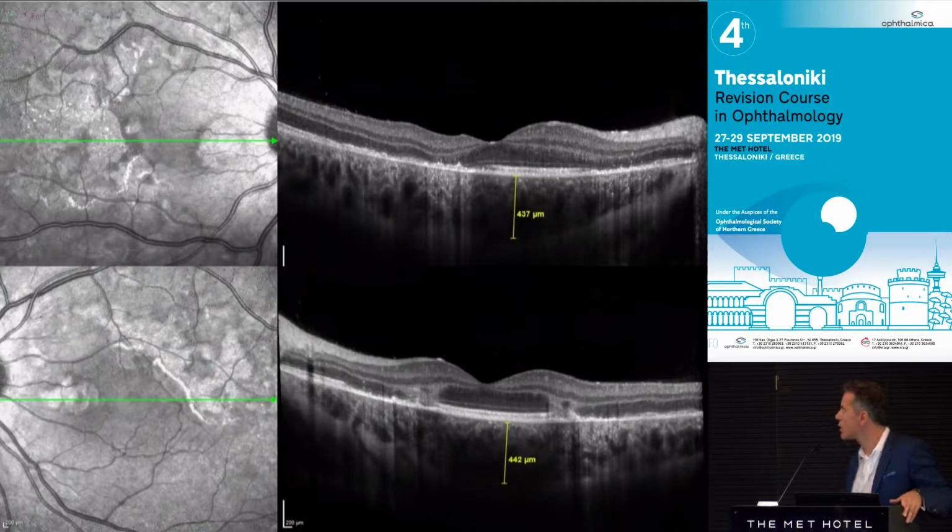And that's the OCT. We can see that there is increased choroidal thickness. There is a severe disruption of the outer retina with a disruption of the ellipsoid zone. The subfoveal region is maintained reasonably. That's why the patient still has 6/6, but he is complaining of blurriness and of restriction of his visual field.